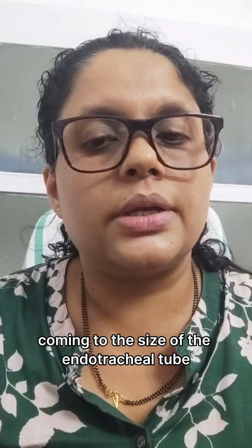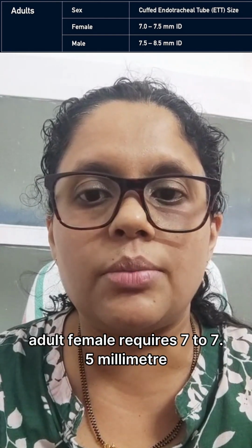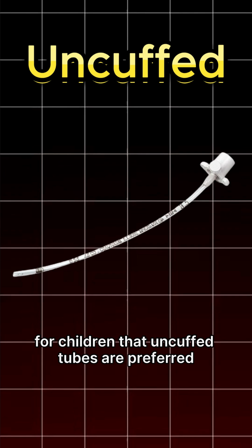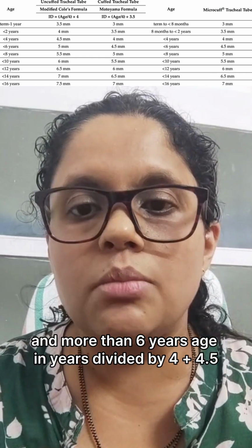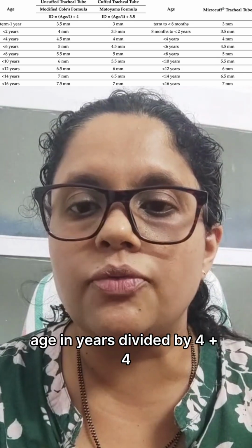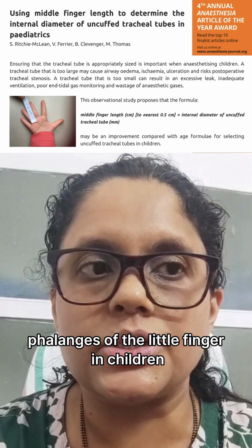Coming to the size of the endotracheal tube, adult male requires 8 to 8.5 millimeter internal diameter. Adult female requires 7 to 7.5 millimeter internal diameter. For children, uncuffed tubes are preferred. Less than 6 years: age divided by 3 plus 3.5, and more than 6 years: age in years divided by 4 plus 4.5. There's a modified Cole's formula which says more than 2 years, age in years divided by 4 plus 4. The external diameter is the same width as the distal phalanx of the little finger in children.